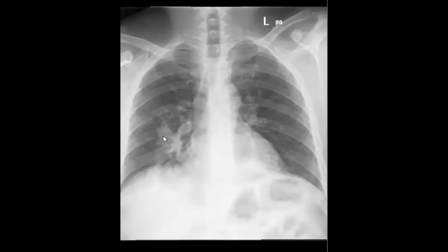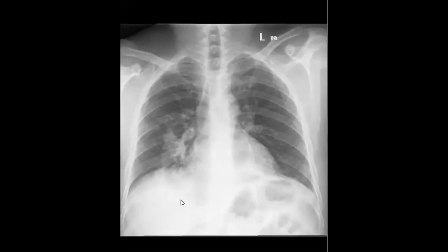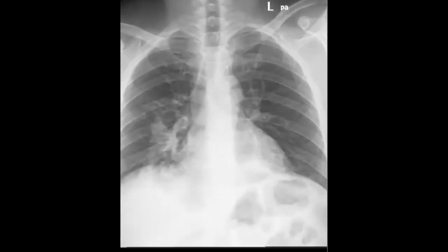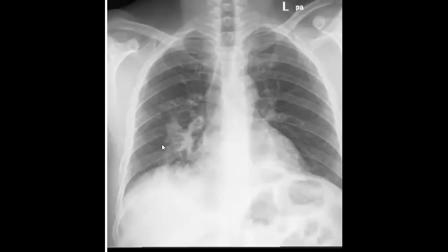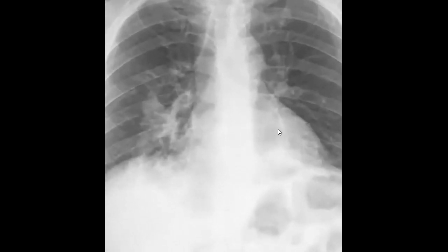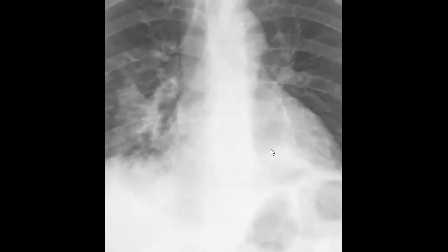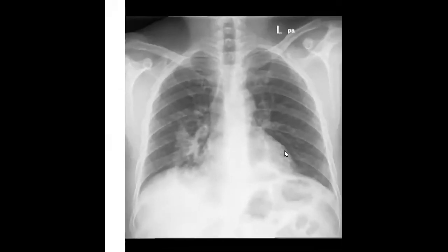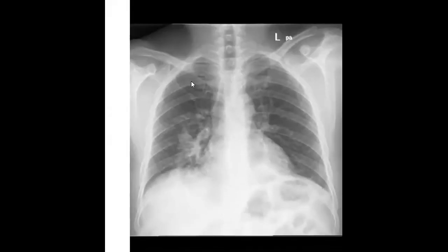So this is again consolidation in the lower lobe, and the good thing here is that it is easy for you to detect this one, right? But it is not easy for you to detect this one, and this is one of the review areas that you should check: retrocardiac, if there is any retrocardiac opacity. So check clearly and try in the exam to make some zooming and de-zooming and windowing until you get the answer.